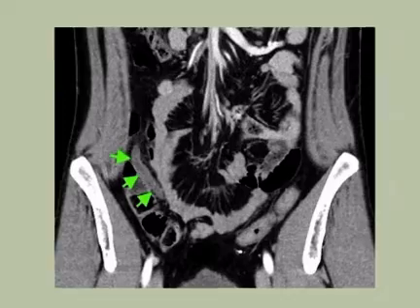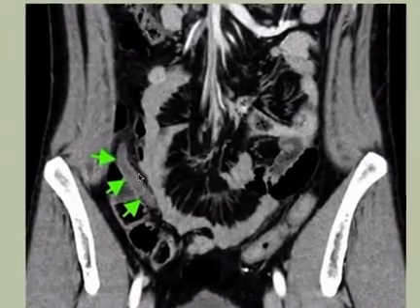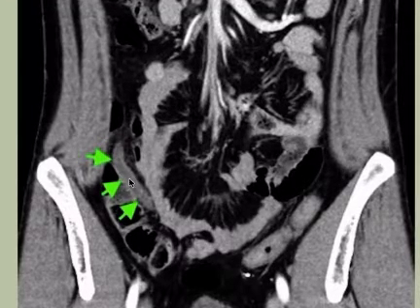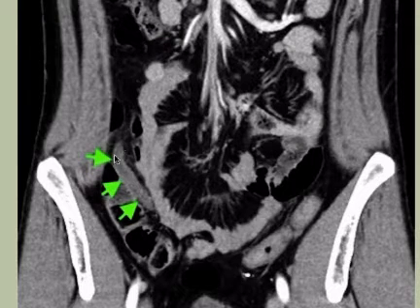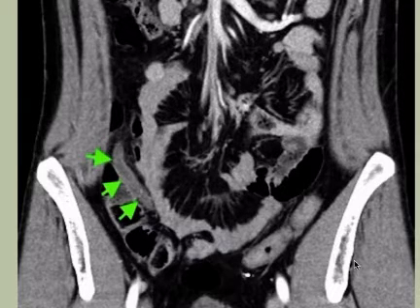And on this CT scan, similar findings. The wall of the appendix is not particularly thickened, but because of the luminal fluid, the outer to outer wall would exceed 6 millimeters here. But just the way this appendix stands out with an extremely mild amount of inflammation confirms early acute appendicitis.